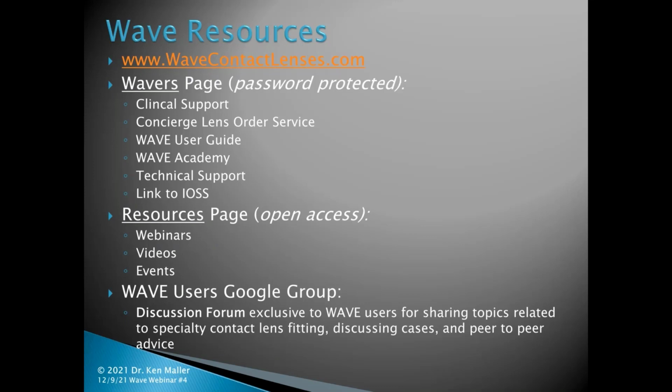Then you have to actually put your cursors down, and this was on a Scout, but you could do that on any of the topographers. They all will give you that information out there. But do remember that if you capture data, for example, on the Pentacam, and you see all those little black dots indicating extrapolated data at 9mm, well, don't go assessing what's going on out there, because it's made up data. You really want to make sure that you're assessing measured data, not the extrapolated data.